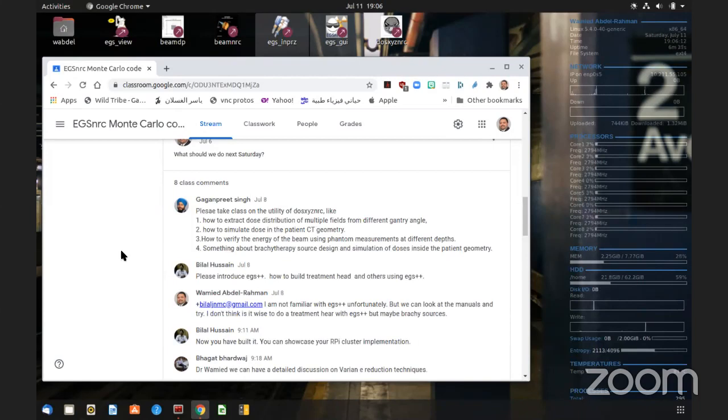So the basic idea is that you do a calculation for the separate fields, and then you combine the dose distributions. So I would suggest trying it with stat dose. The simplest thing is you assume that they're equal weight, so the same MUs. So that's my suggestion.